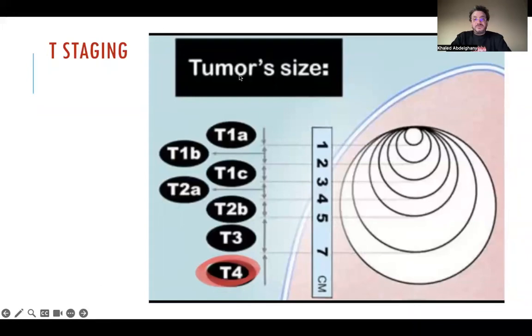This is part two regarding the male, 61 years old, right lower lobe, large central mass, inseparable from mediastinal lymphadenopathy. First thing, the initial step for T staging is the size. According to the size, we have a large mass exceeding 7 centimeters, which dislocates the T staging into T4.